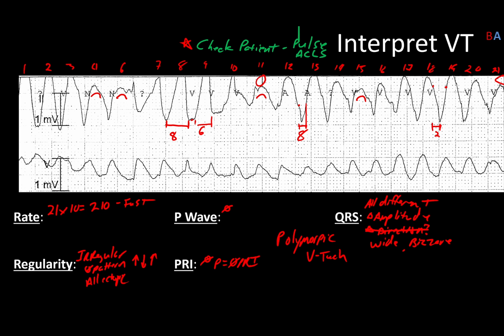We withdrew vasopressors and the ventilator, with the family's permission, and the patient passed away rather quickly, within a handful of minutes. Once they stopped breathing, no oxygen is being added to the blood supply, so slowly the body used that up, in particular the heart. He had global cardiac ischemia, and the entire heart just kind of died on its own. This is one of the rhythms that heart produced, and this is a polymorphic V-Tach.